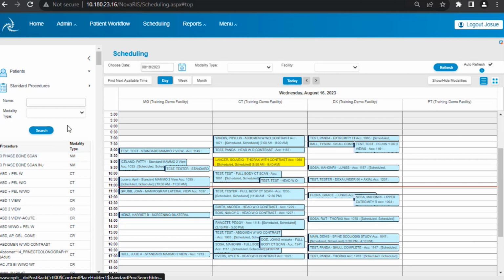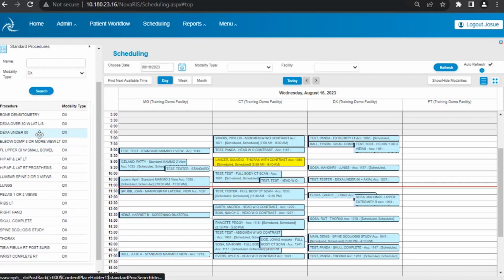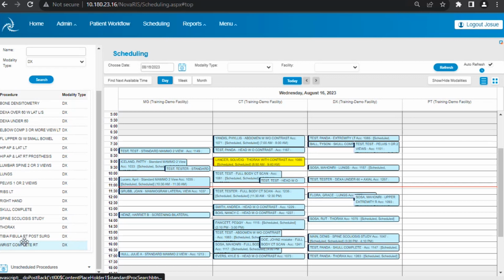So in this case, I'm just going to do one of those. So for example, you can go into the standard procedures, right? And if they are going to be asking me, you know what, I do need an abdominal X-ray study that my doctor says, but he says that we will need an additional information, a sagittal view that normally is not part of that one, to have a better view of the liver, for example. So one of the things that you will see is if there is something that is not normally there, in this case, sorry, I'm going to go into my X-ray studies. And as you can see, I can see the list of all my available procedures that I can do. And I do have a standard thorax X-ray, but I don't have a thorax X-ray with that additional sagittal view that they might be requesting.